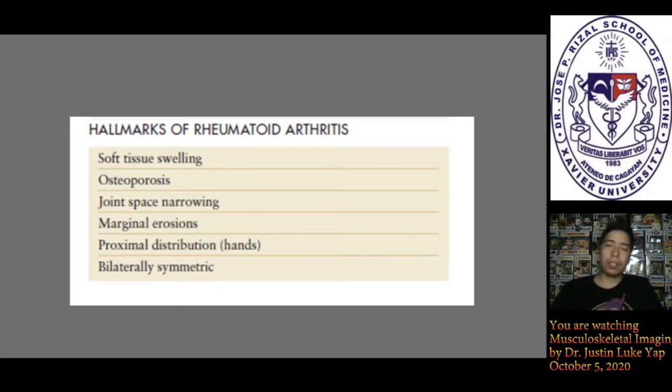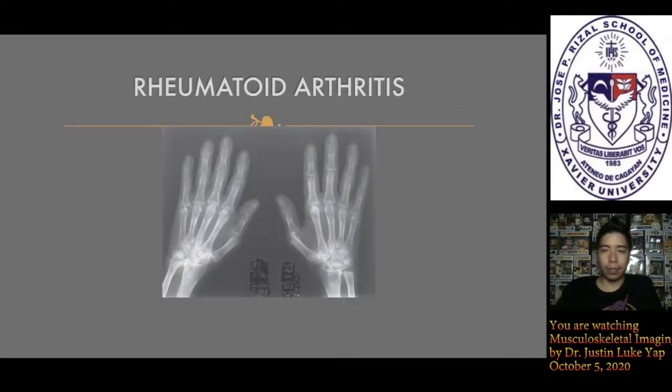Now, osteoarthritis may not be symmetric, and it doesn't usually present with erosions except for certain areas. Joint space narrowing is consistent more or less in all arthritis. Now, what's key is that there is osteoporosis and also there is soft tissue swelling. And usually these patients also may present with severe pain. And the osteoporosis in RA is more periarticular in location, so meaning near the joints.